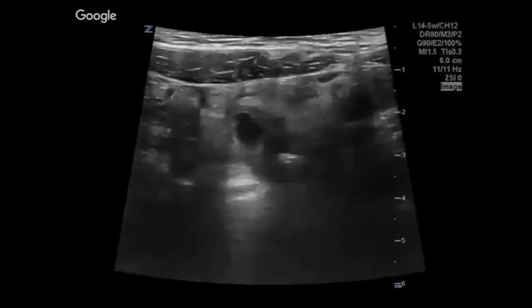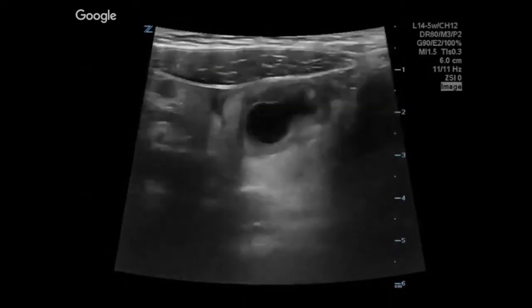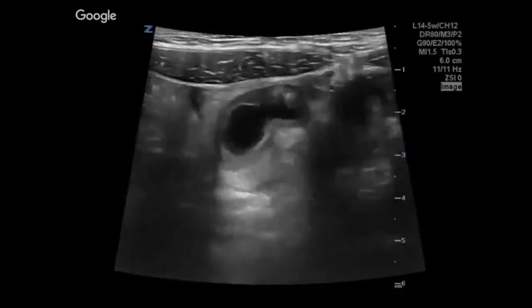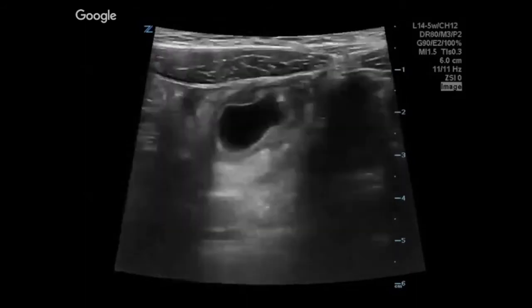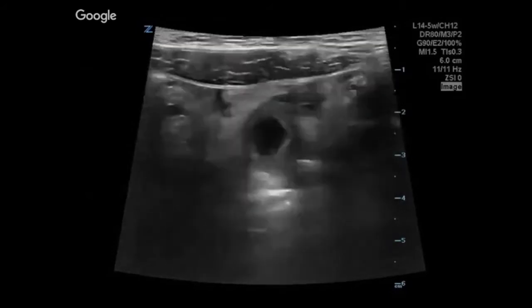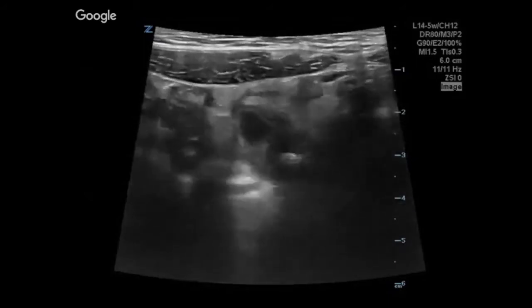And here, you're in the abdomen. It's a patient who has had abdominal pain for the past 3 weeks, has had a couple of ultrasounds done. This image I remember. This is the kid with the mirror. Yeah, exactly. It's a Meckel. And how can you differentiate that from? We can't.